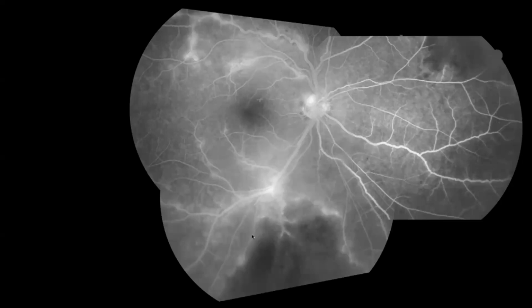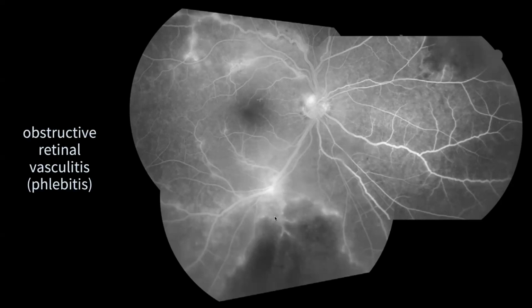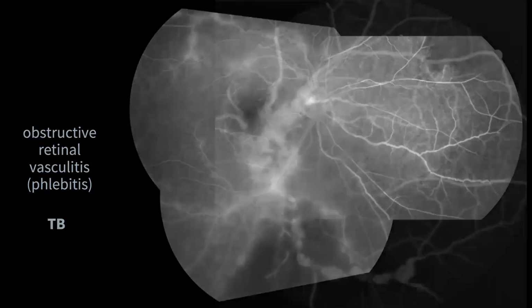And then you have here, what's this one? Hypofluorescent lesion. Of course you need a fundus photo, but this is from capillary dropout. Because of the inflammation here, there is occlusion here. So this is occlusive retinal vasculitis, specifically phlebitis. And because it's phlebitis, you would now think of things like TB. You won't think of things like viral diseases, right? Okay.